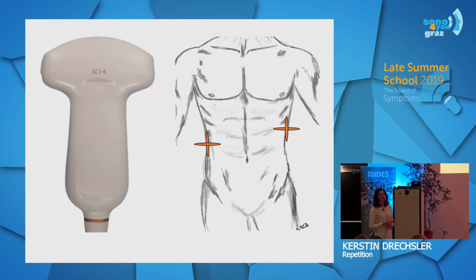What are my take-home messages in that case? So if a patient complains about flank pain, you might want to make sure to check the right and left flank. And you also, once again, want to scan the regions around the affected organ. So it might not be enough to only scan the kidneys, but you should also check the perirenal space. In case we'd only checked the kidneys, we might have missed the perirenal abscesses.